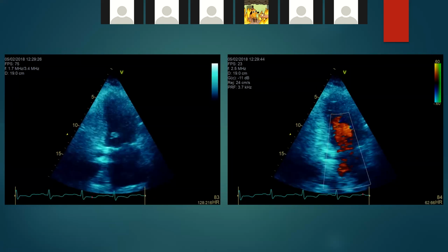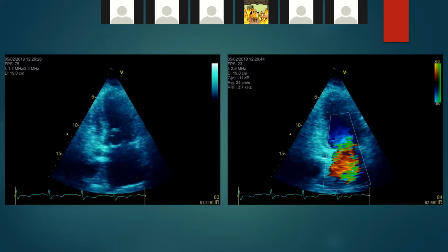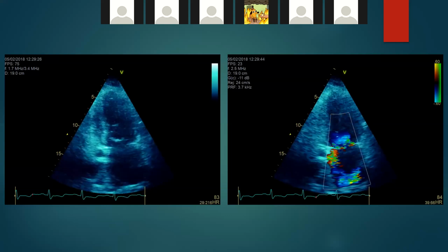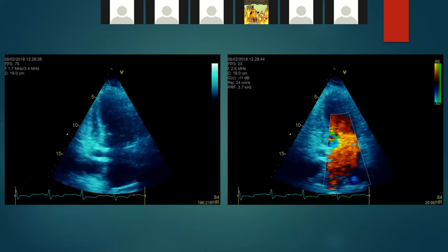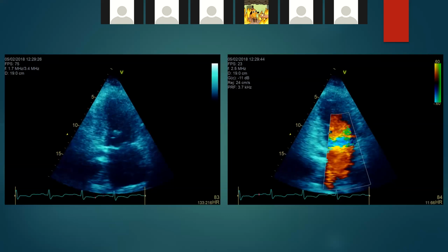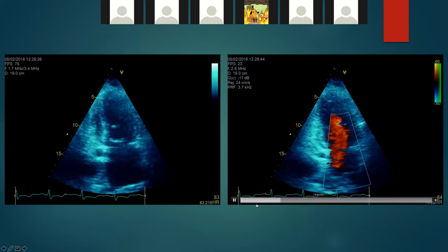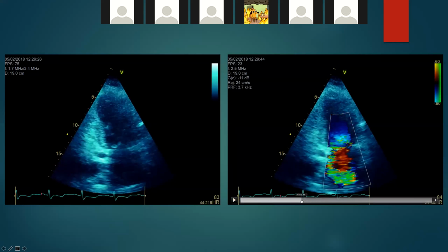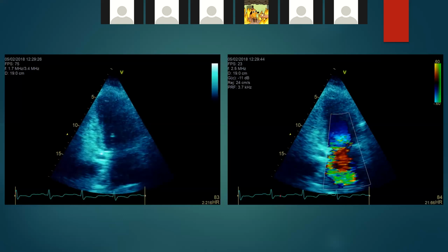So if that's a 2-chamber view, again, I'm not certain, but from right of screen on that first image, would that be P1, A2, P3? Yeah, okay. And again, this is probably a better example of just the kind of eccentricity and the Coanda effect, where it kind of goes in some loops. You could probably stop it, but you can almost envisage it hitting the wall and circling almost 180 degrees, almost all the way around the left atrium. So there's an enormous amount of force behind that.